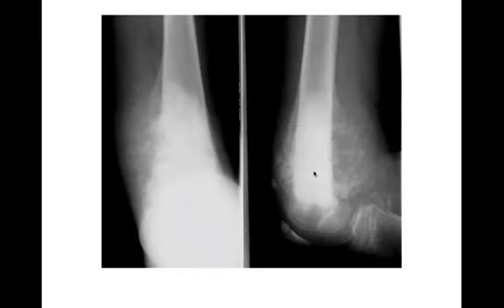We saw this one earlier. This was the osteosarcoma, again, just showing us the Codman's triangle and the sunburst in the areas of hair on end periosteal reaction, and the sclerotic lesion in the distal femur. Very aggressive looking osteosarcoma. You're not going to mistake this for a non-aggressive or benign periosteal reaction.